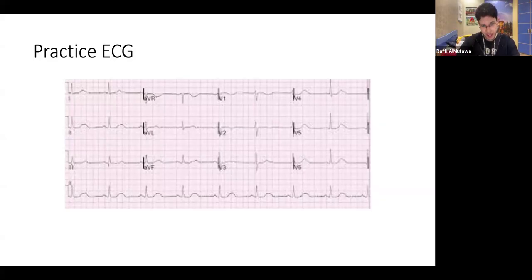So let's practice here. Now, did I make this low quality image on purpose? No, but you might get low quality images on your exam, so I'm doing this as a favor. So you're welcome. So what do you guys think this is? Slow rate, but kind of regular.